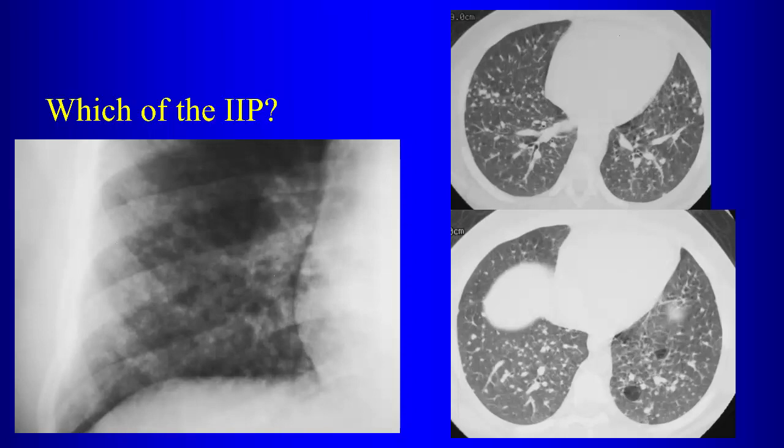No, we don't really have interlobular septal thickening. It's not the predominant abnormality. Is it reticular or nodular? It's nodular, right? So, do you see nodules here? Yes or no? On the CT. Yeah, on the CT. Yes, right. These are all nodules. See those? Okay, we have nodules.